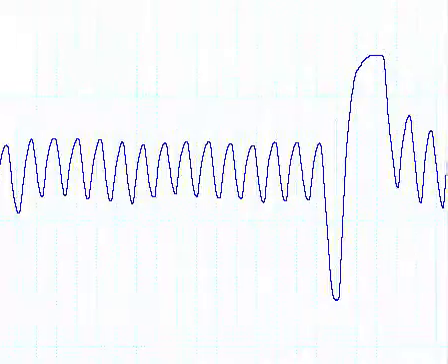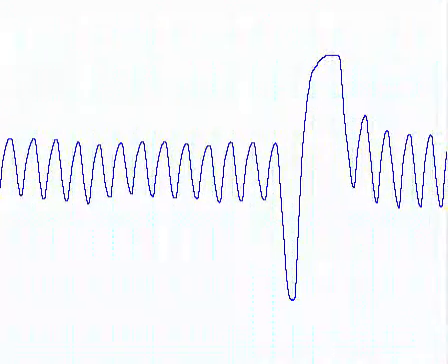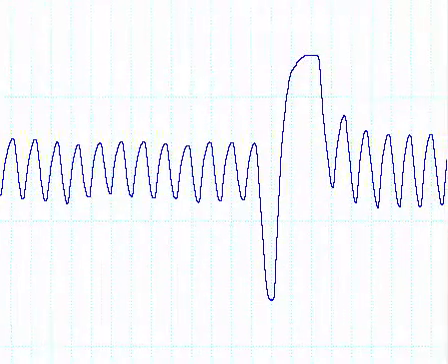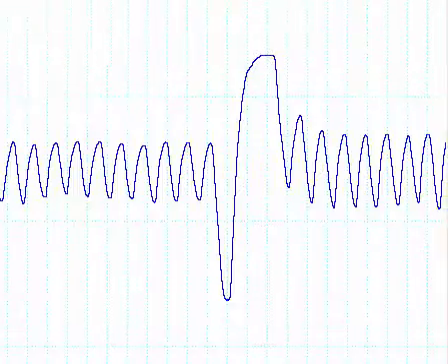Here you should see what a spirometry trace should look like with normal inspiration and expiration occurring. The spike in the middle of the trace being a forced inspiration and expiration performed to help determine abnormalities in lung volumes.